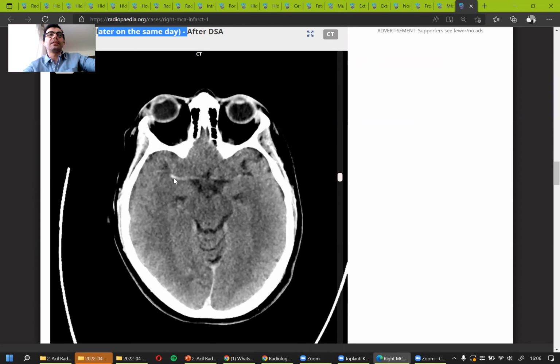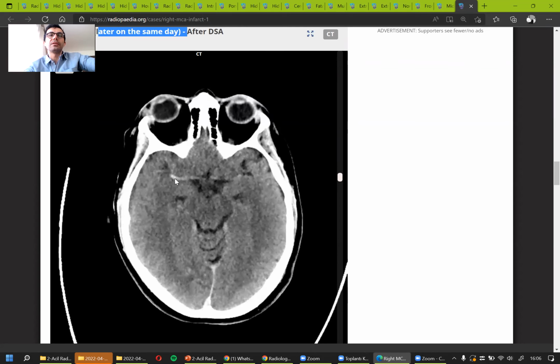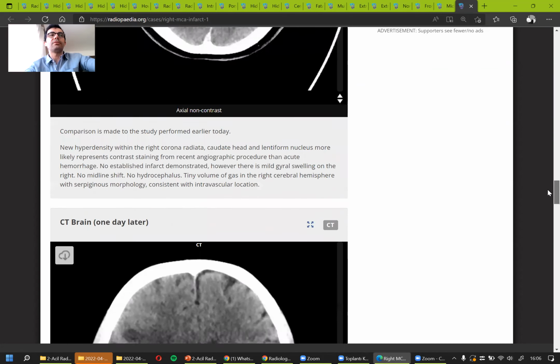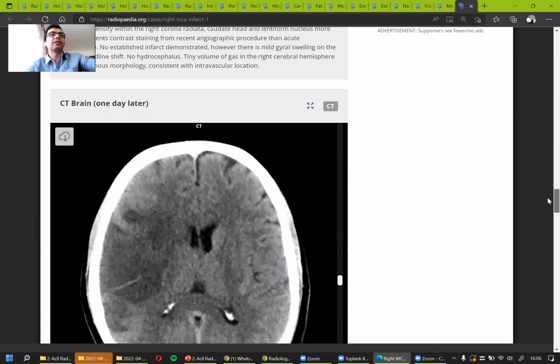As in the case of an intra-arterial embolus, it also looks brighter, as in this case. And the patient's right artery is obviously brighter here. But it's a very difficult diagnosis anyway. It's not our point.